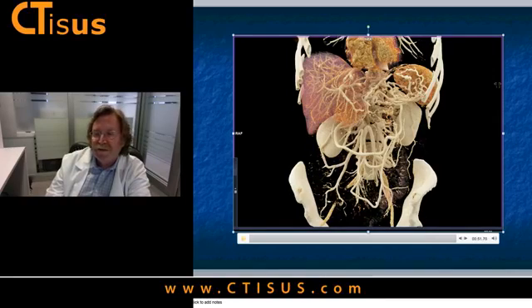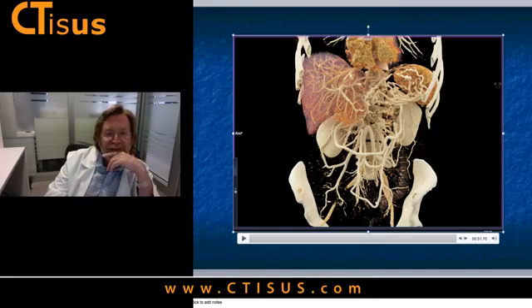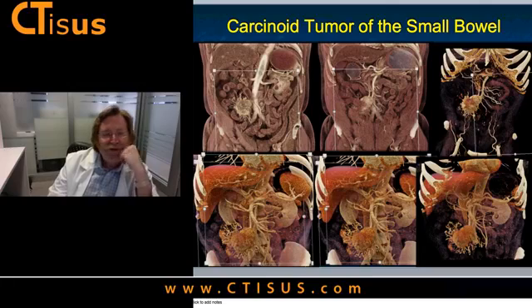And Clara is the new NVIDIA medical platform, and I think they may end up with things like cinematic rendering on a platform. So it could be very, very interesting, but you can see the details of what we're able to see. So I guess the question is, how do you go forward? And I'll just jump back to one of my other slides, which is this carcinoid tumor.